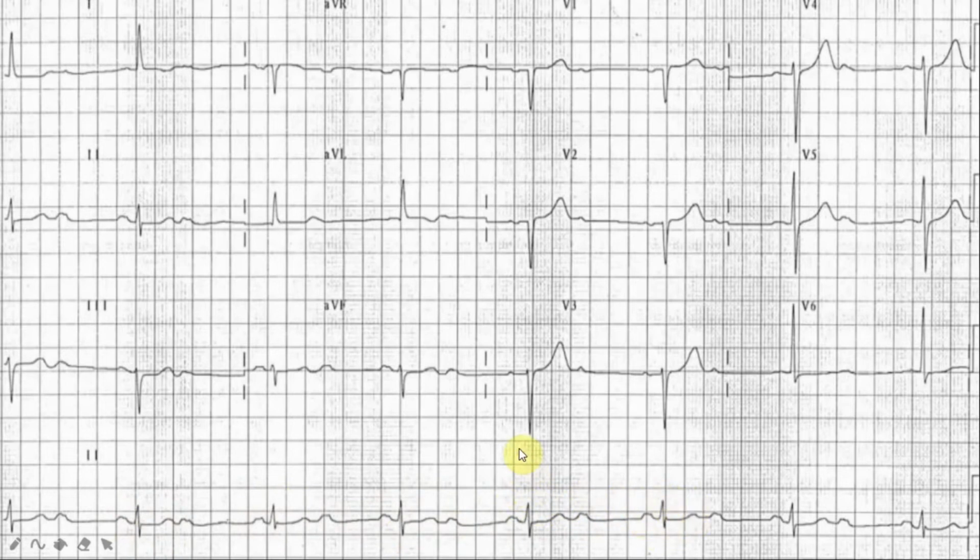The QRS complexes are regular. The axis of the QRS complexes is about minus 45 degrees; in other words, there is a left axis deviation. The P wave is wide and bifid, which signifies left atrial hypertrophy. The PR interval is constant. There are regular non-conducted P waves. In this ECG, we have one QRS complex for every 2 P waves. Therefore, there is a 2:1 second-degree heart block.